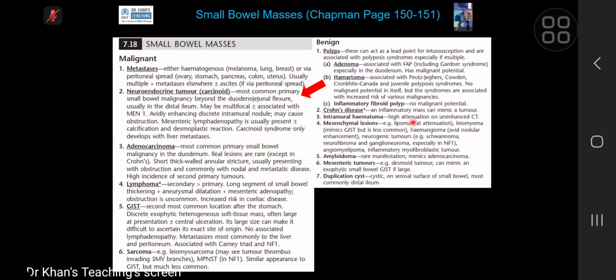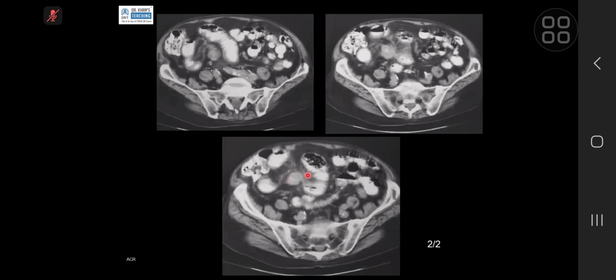Nobody is going to show you an enterocolysis, but I just wanted to highlight it just for the concept, because now is the world of CT scan. Now, what happens is that carcinoids, remember the chemistry, and you can make your radiology as well as anatomy. Carcinoids cause desmoplastic reaction because they produce serotonin and kallikrein, which produces fibrosis in the adjacent mesentery. So the strands of fibrosis will appear as a stellate type of appearance on a CT scan.